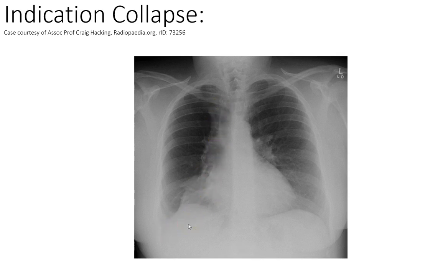Classically, if you're talking shift of structures, the upper and middle lobes would cause tracheal or cardiac deviation. The hemidiaphragms more when it's the lower lobes and so on. Then you get shift of those structures. So this looks to me like a consolidation collapse of the right middle zone.